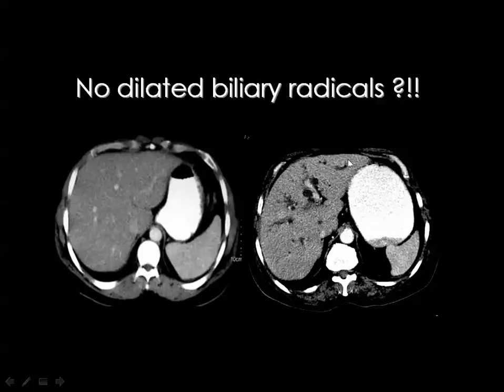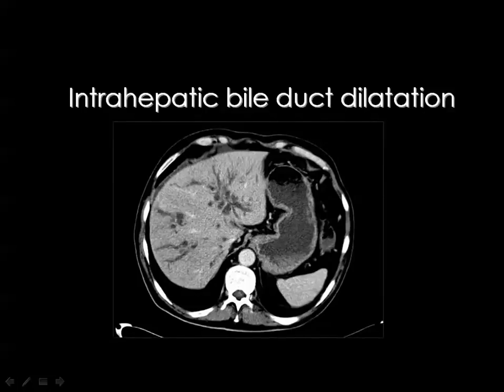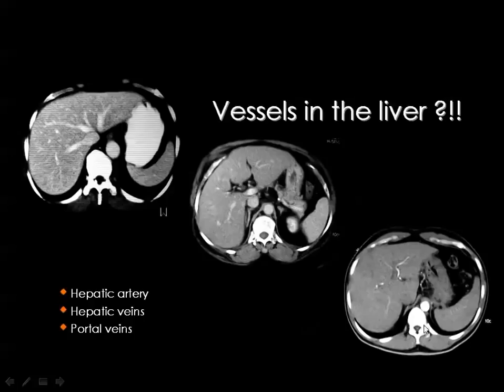Then you can look at this liver and you say that these are obstructed ducts, and this is a case of biliary obstruction. Then you should go further, and I will discuss this in detail in the lecture of biliary imaging, looking for the site of obstruction and the cause of obstruction. But the initial diagnosis should be biliary obstruction whenever you can see multiple linear hypodense shadows going throughout the liver parenchyma.